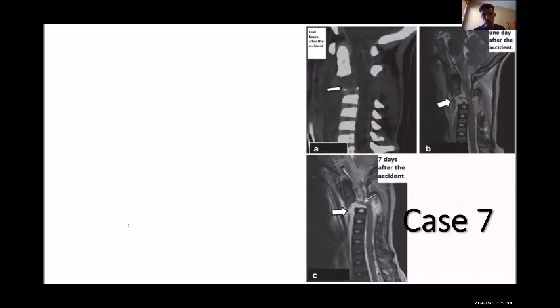Okay, so looking at comments. And remember, just describe. At least I would say, I'm losing the vertebrae. There is vertebrae here, there is vertebrae here, there is no vertebrae in this area. On T1 and on T2 also, you can see the vertebrae is very nice looking. There is nothing here. Same here, there is disconnection between this and this. Even if I don't know anything, I would say that.